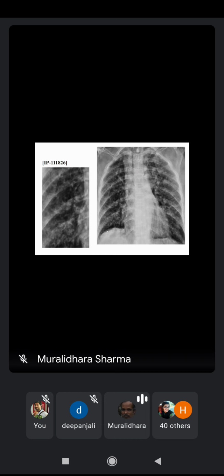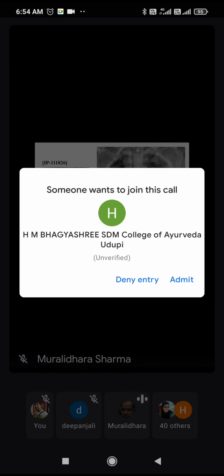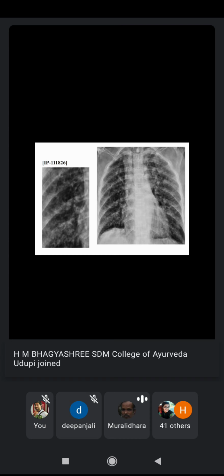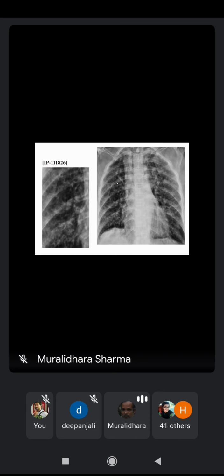Another example of the same, a still more advanced interstitial lung disorder. In this X-ray, it's quite obvious that the total expansion of the lung tissue is reduced, in the shape of the intercostal spaces. It's quite typical, it seems to be converging. Of course, in this X-ray there is a technical error. The technical error is that the scapula is not fully retracted.